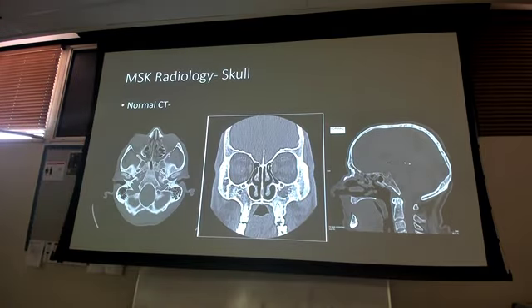on the CT. Now on the CT, I can make out the zygomatic arches. I can make out the full orbits. I can even see my ethmoid sinuses sitting in here. Zygomatic arches, part of the skull. If I go laterally, I can make out the entire skull. I can see part of the mandible down here, part of the maxilla up here. I go down here, I've got mastoid air cells. So here are my mastoid air cells. I can even get into the ear and the auditory canal area.